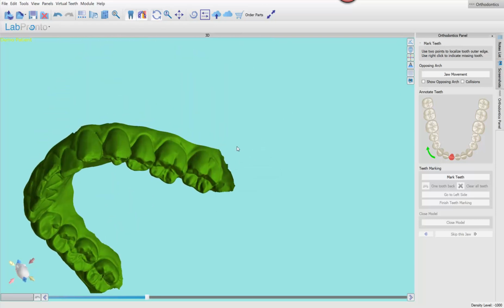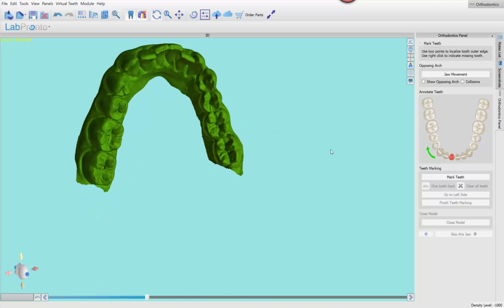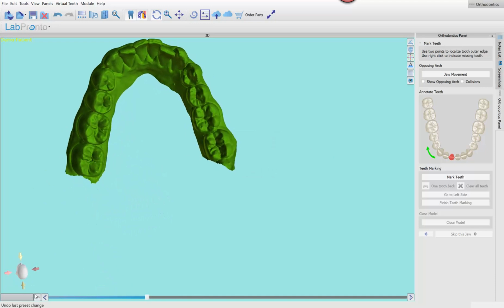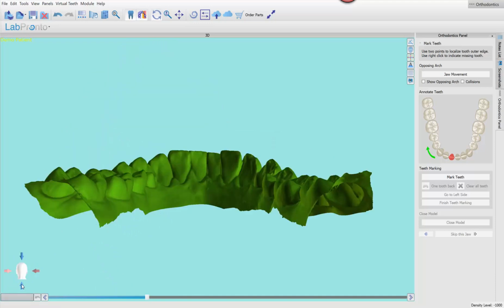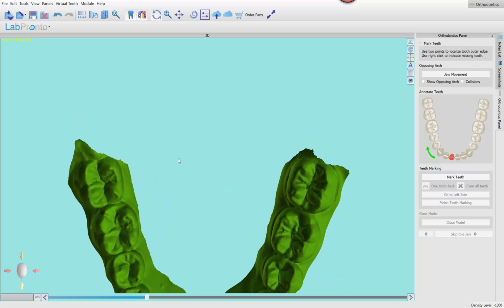All right, did I get this one? Yeah, I'll trim that. Not probably that necessary, but okay. Don't have much landing area back here, which sort of complicates it a little bit, but we will be fine. Get the heels in the center of the window. Yeah, I'm probably gonna have to clip right off there, unfortunately.